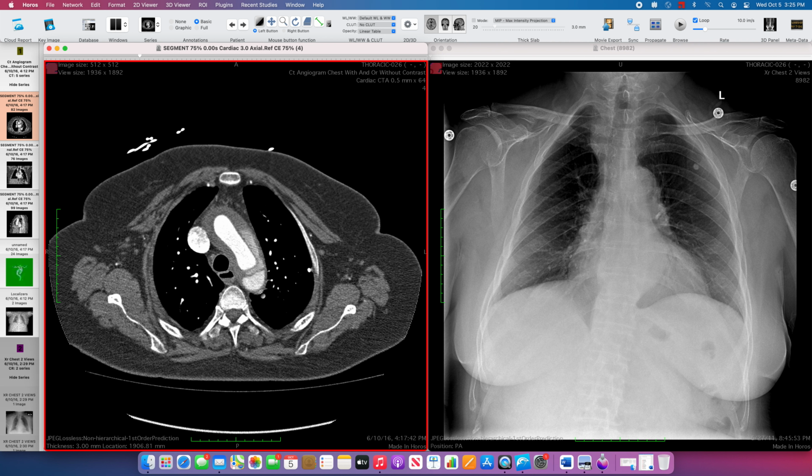That's because that's where there is an intimal flap. There is a tear in a portion of the wall of the aorta, and contrast is going through that hole and into and dissecting the aortic wall.